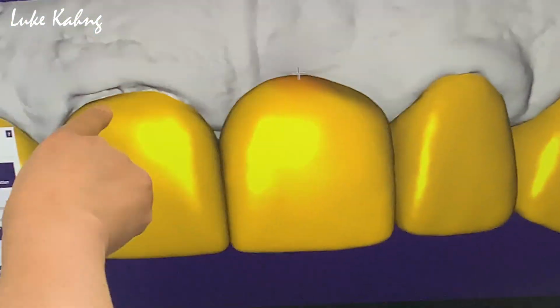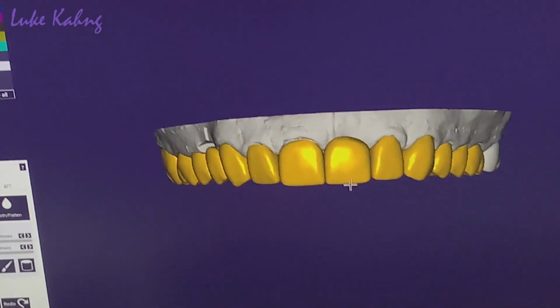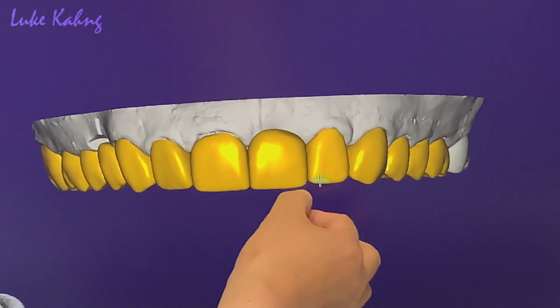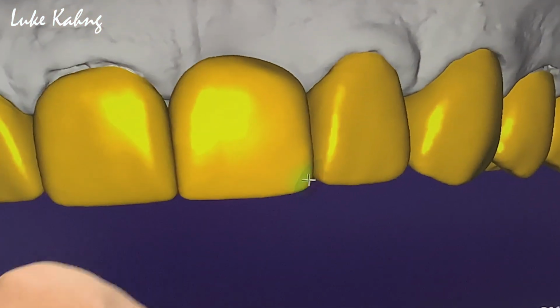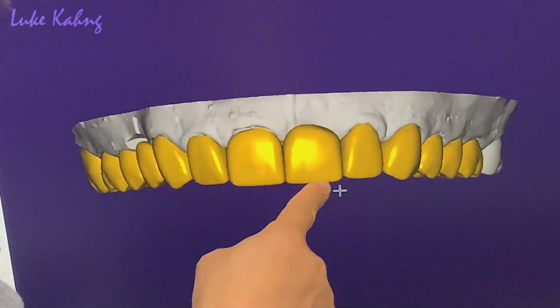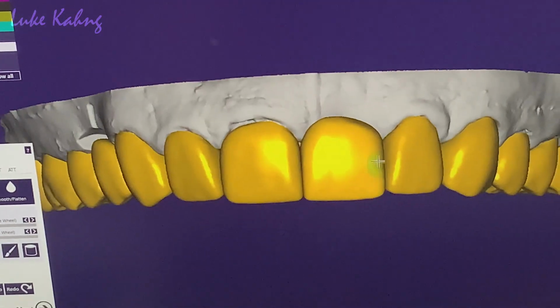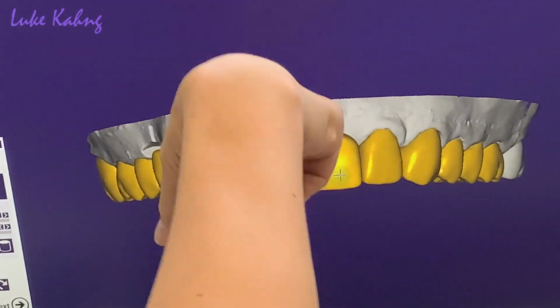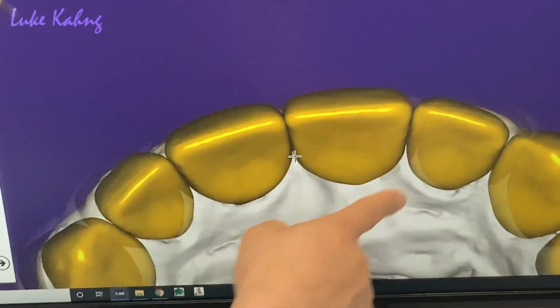There's a flat, just like that. Better. I still need this and this. And the longer. Point it. Alright. Here make it a little bit thicker, just like that. You see over here? Now this 3 unit bridge. Yeah. Okay, occlusion view. So I like this. You have to make it a little more thicker only here, later.